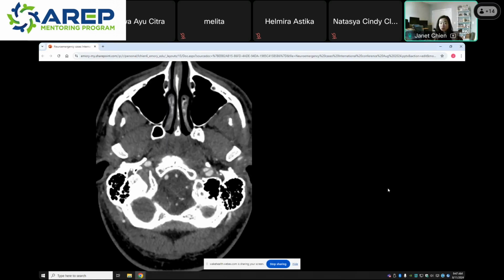This is a tough one. So remember, your cranial nerve 10, 11, 12 all run together in the suprahyoid carotid space. Cranial nerve 12 is going to exit out of the brainstem into the hypoglossal canal. 10 and 11 are going to exit and go into the jugular foramen, but then they join together in the suprahyoid carotid space. And so, look, there is a dissecting pseudoaneurysm of the left ICA, kind of similar to the previous cases that I showed you at the cervical petrous junction.